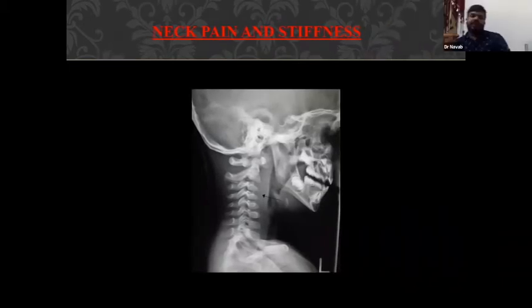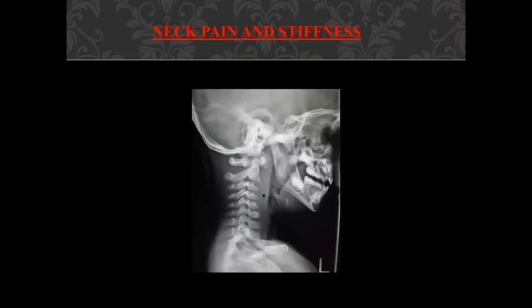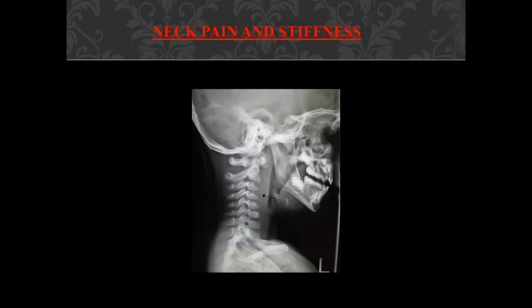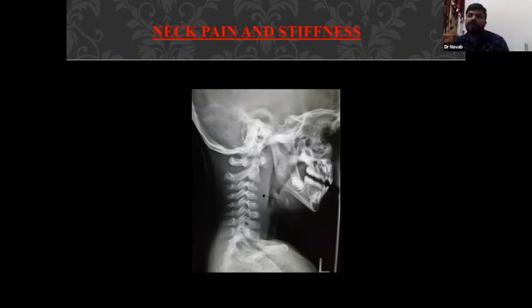Next person will take, Dr. Arya, can you hear me? Yes, sir. So, what do you see in this case? There's widening of the prevertebral space in the upper region. What is your measurement to say it is widening? C2 level and C6 level? What is the cutoff? It is around 7 mm superiorly at the C2 level, and 21 mm inferiorly.